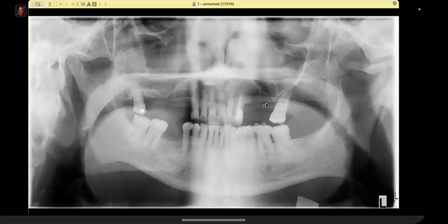I can see that there is an ill-defined area, sir, it's out here. No, not ill-defined, don't worry. That's just projectional. Don't worry about that. I'm not interested in the mandible. Over to you. Okay, sir. So please remember that swelling is in the left upper cheek.